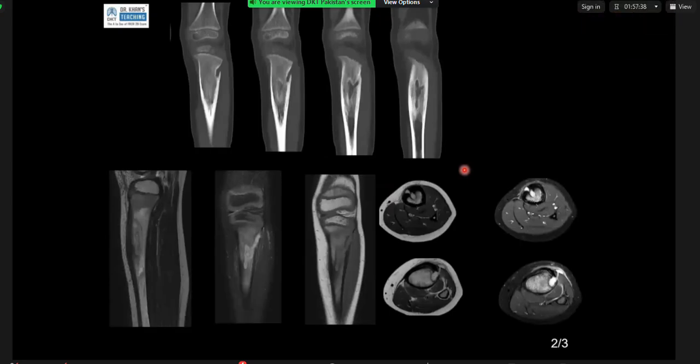Okay, on CT scan, I can see a central lucent lesion with surrounding bony sclerosis and a defect coursing cranially, in keeping with a cloaca.